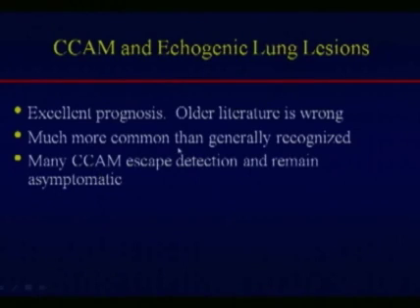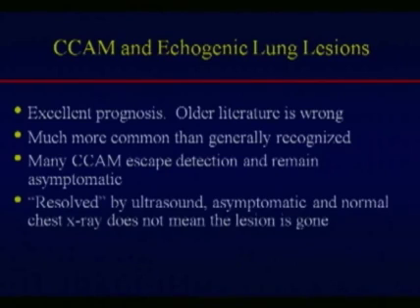A couple conclusions. These echogenic lesions are certainly more common than generally recognized, and in fact, if we don't look in the second trimester, we may miss them entirely. And since the patient may be asymptomatic at birth, if the patient wasn't scanned at the right time, they would go completely unrecognized. Even when they look like they're resolved by ultrasound and they're asymptomatic, it does not mean that the lesion is gone, and it may persist.